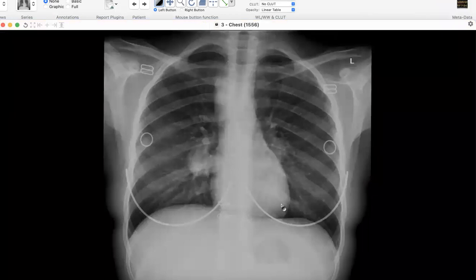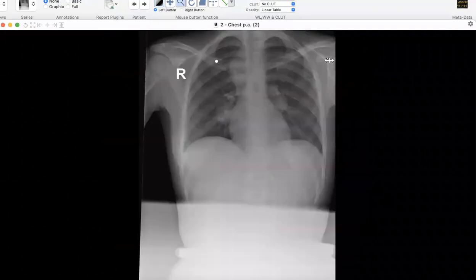Before jumping to the fancy diagnosis, it's important that we go systematically. Hilar mass, rounded hilar mass, paratracheal opacity: the first thing you'll say is lymphadenopathy. Next, you'll say something like vascular structures, or bring in the fancy differential. We thought it was lymphadenopathy, so we suggested treatment for infection. She also had some fever. Second possibility, we did give it as lymphoma, but then they didn't take it seriously at that time.